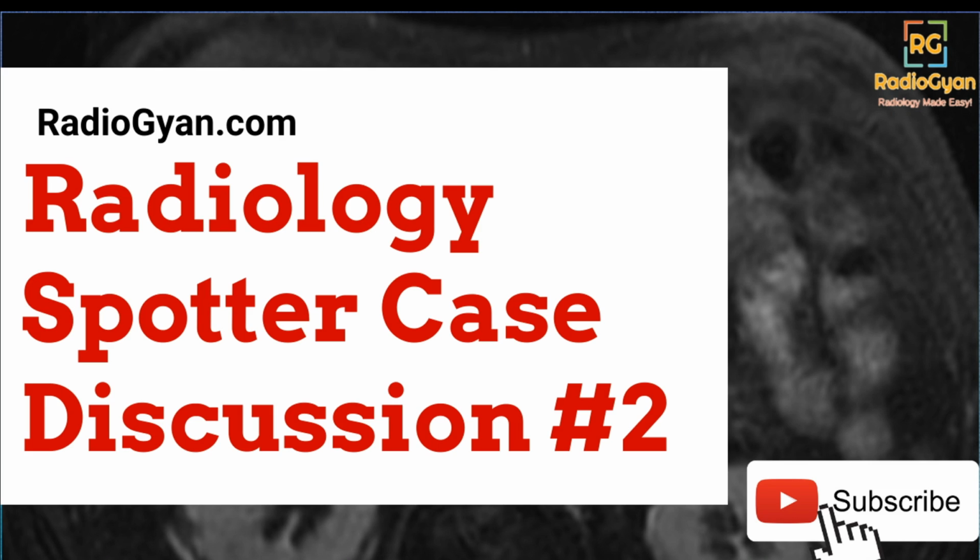So how it works is that we have 10 classic radiology cases, also known as mini cases. There's a single image. I'll show a particular image and you can type in your answers in the comments section. I'll wait for around 15 to 20 seconds for each case, and then we'll have a short discussion for each pathology. We'll try to keep the discussion short so that we cover more topics rather than concentrating on a single case.